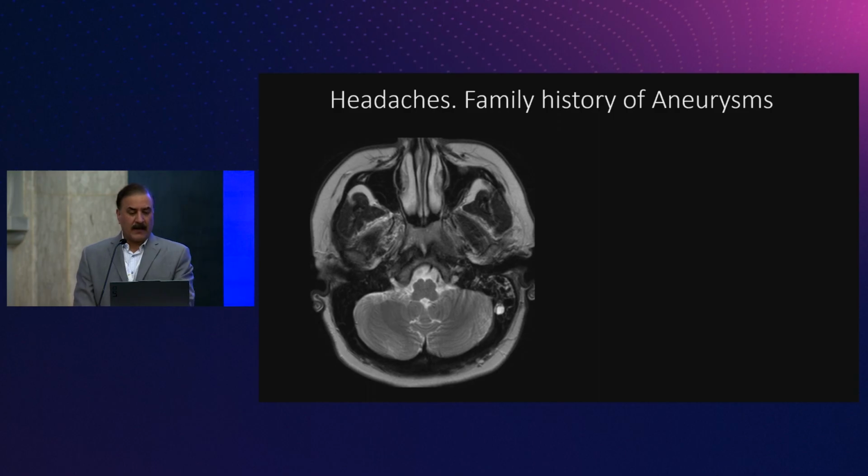This was actually a medicolegal case. This was a person with a familial history of aneurysms and a small PCOM aneurysm. So they were getting an MRI non-contrast brain and an MRA on these patients regularly. Here you can see there is definitely some prominence of the adenoidal tissue, but you see there is asymmetry in the fossa of Rosenmüller. This was missed. Important, what I told you earlier: opacification of the ipsilateral mastoid sinus in an adult. Do not let that go, please.